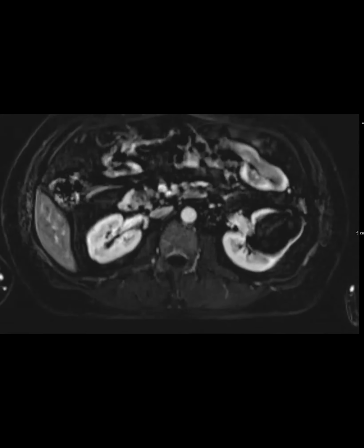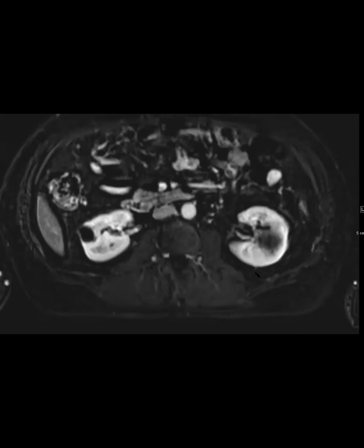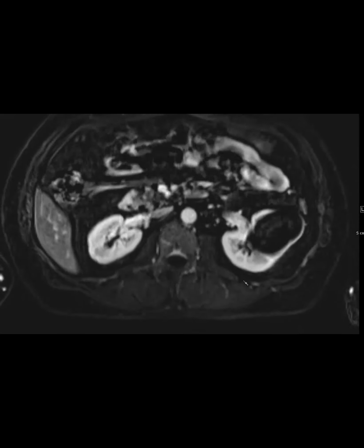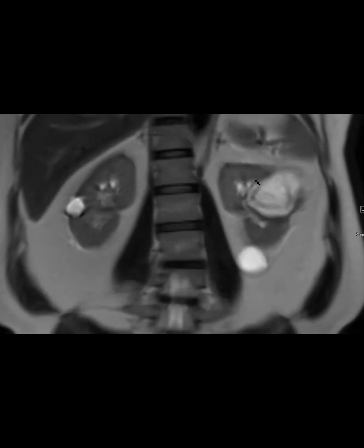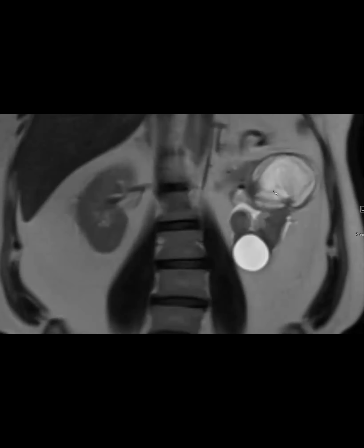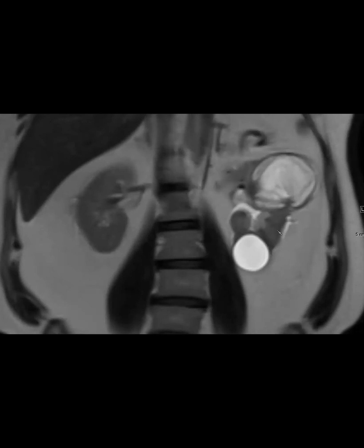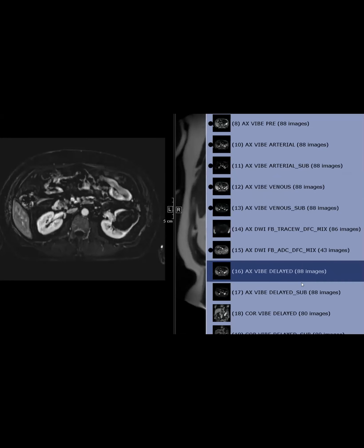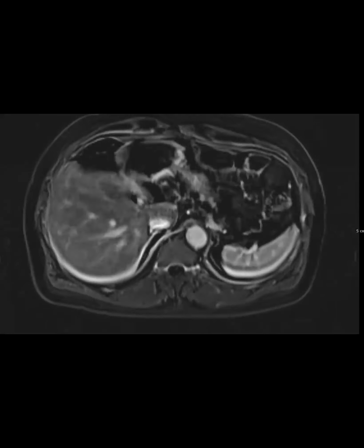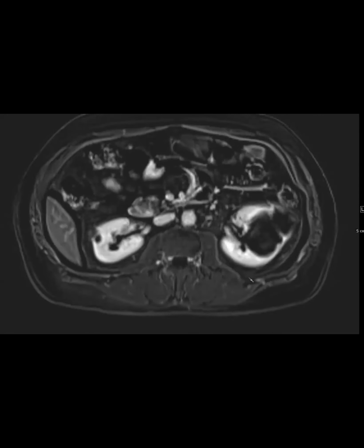Post-contrast was pretty confusing, so I'll just go to the subtractions. And this patient was having hematuria, and we thought that this was basically some misregistration. We didn't think that there was true nodularity in it. And Bhavik says hi in the chat. And then 6 months later, they came back, and this is what the cystic lesion looked like. And we can see that maybe there's some nodular components centrally here. And I will just cut to the subs. I think this was the one. And we were concerned that there was some nodular components here.